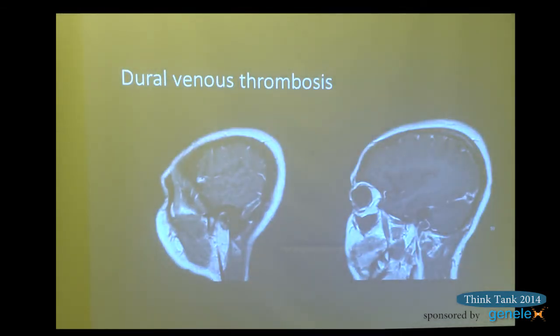Just that on some of the MRIs, is the contrast reasonable there? These are 2 images from this person's MRI of brain with contrast. Normally, this should be filled with bright signal because it would be venous blood. Instead, there's blood clot.